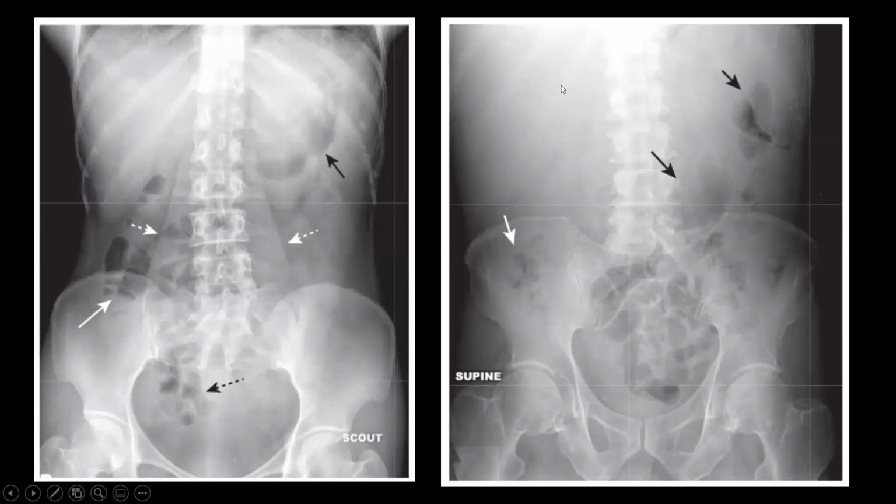Now, this is a patient who has hepatomegaly, and because he has hepatomegaly, this gas pattern is being displaced from its normal site, which it should be in. So this patient is having hepatomegaly. And how did I say that? Because this normal gas pattern is being displaced more towards the other side. So this is how I say that I might be having this hepatomegaly.